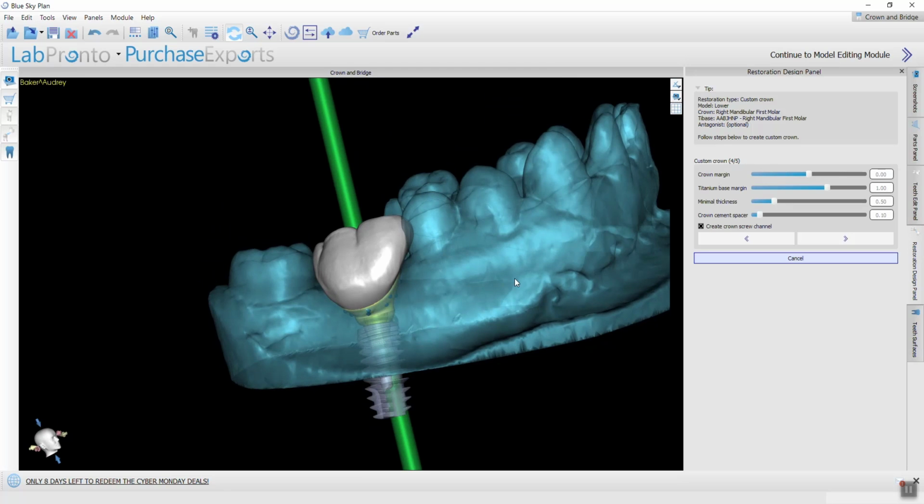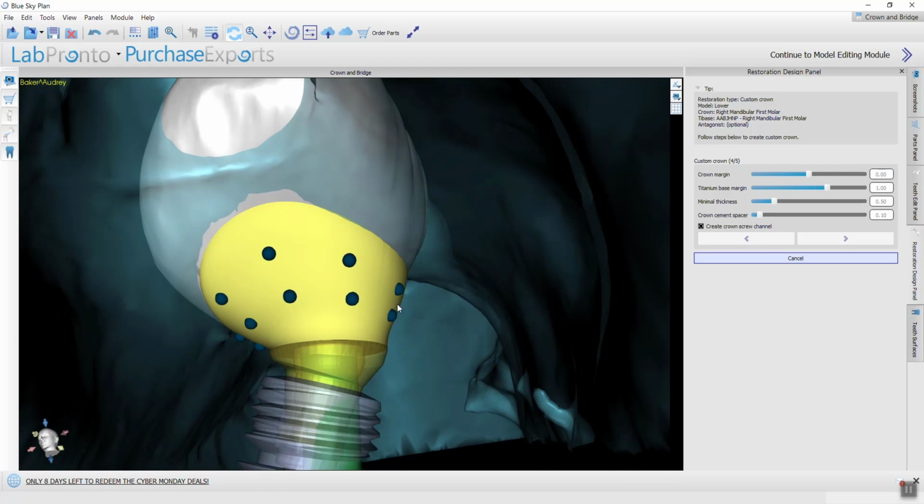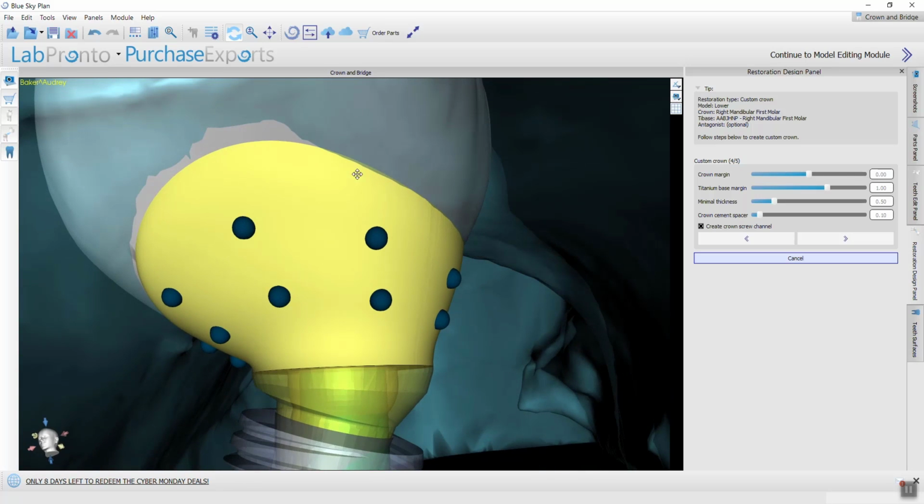So now you'll see the model transparent, and here you'll see a couple of blue notches that when you pass the cursor through, you can see them yellow. So at this point in time, you can just modify them with the left mouse button, or if you hold shift, you'll modify them all together. Okay, and basically that's the functionality.